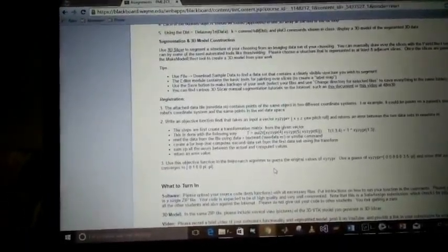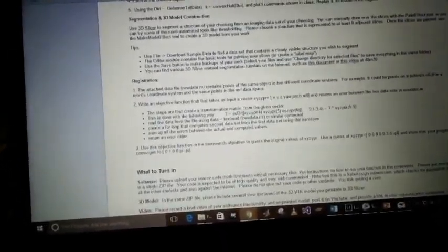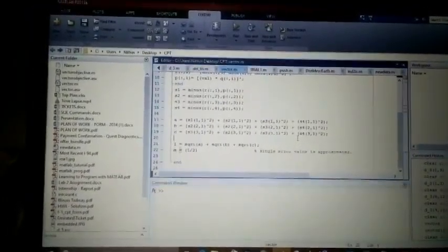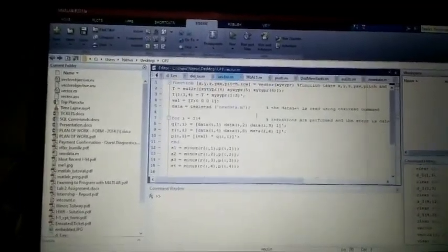After generating the transformation matrix, it reads the new data.m file and takes out the data points, performs the error calculation, and eventually gives us the final error value. For this, I have written my own program and function. The function that I have called is called vector.